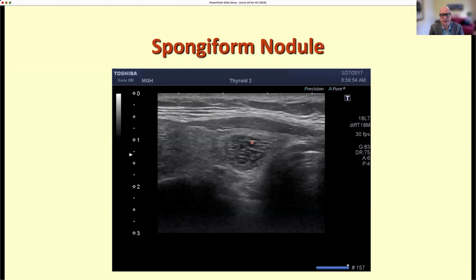occupation by cystic, but this is a typical nodule. It is a colloid nodule. Once you learn them, it's very easy. You don't need to bother doing anything else. You see this nodule, you decide whether to do a biopsy or not, depending on the size. Some people will still do a biopsy in some of these where they're very large, but most often these nodules are benign.